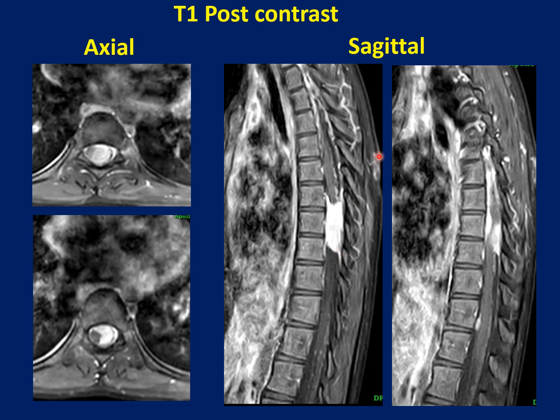On closer inspection, there is also a subcutaneous well-defined T1 hyperintense enhancing mass lesion which is seen in the subcutaneous fat overlying the thoracic spinal cord. It is also noted here. In the axial images, again, the intense post-contrast enhancement and the relationship between the tumor as well as the thoracic spinal cord is seen. The thoracic spinal cord has been displaced and compressed towards the right side by the mass lesion.